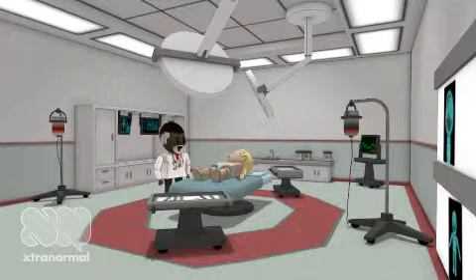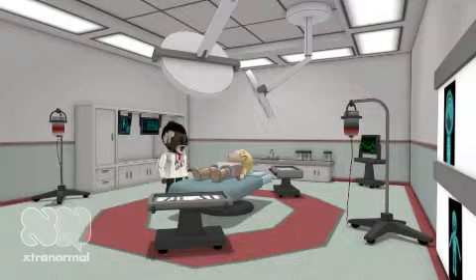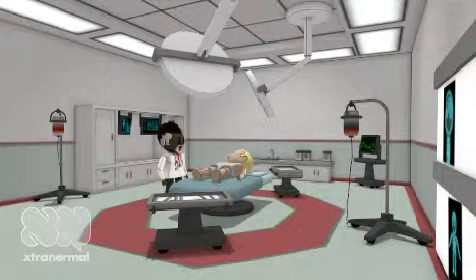Pressure targeted SIMV. All mechanical breaths are delivered at preselected pressure control, assisted with interposed spontaneous breaths. Each breath is patient triggered, unless the patient becomes apneic. Flow time tracing shows the pressure control breath with a characteristic descending flow pattern. Pressure time patterns show a pressure plateau during mechanical breaths. The spontaneous breaths are identified from the inspiratory pressure below the baseline and expiratory pressure above the baseline. Volume time waveform indicates an increased delivery of volume, a volume plateau and decline to baseline during mechanical breaths.